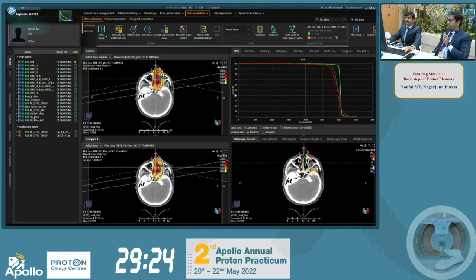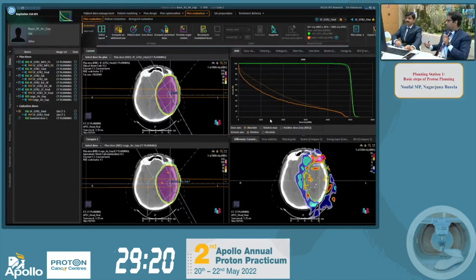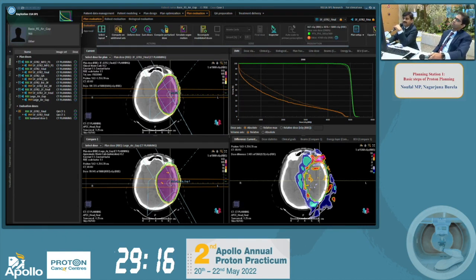So it is like pulling the dose towards the periphery. So it's like bolus in photons. Yeah, you can say like that. So here you can see this is the nominal plan. We'll call it the nominal plan. We keep our range shifter positions at 5 centimeter depth.